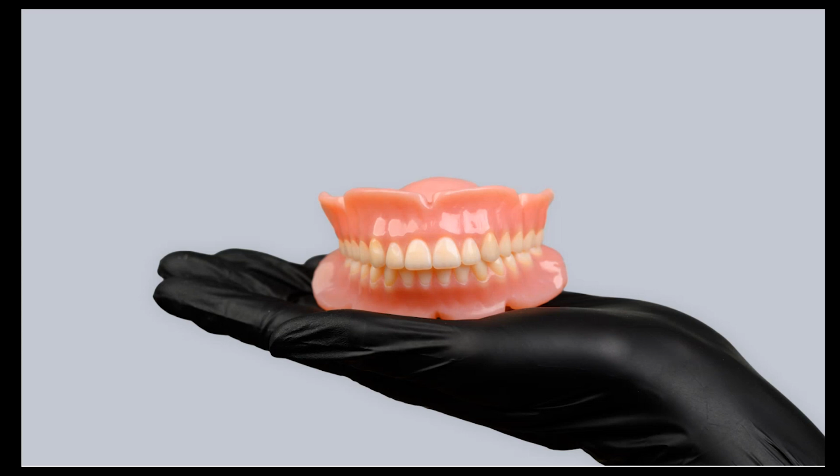And by using the section view on the top right here, you can see that there are small gaps in between the base and the teeth. This can be a trap for support material and can degrade the properties of the printed denture. We do not recommend using gaps in teeth in general. So I took this model out of the tray for the next step of the demo.